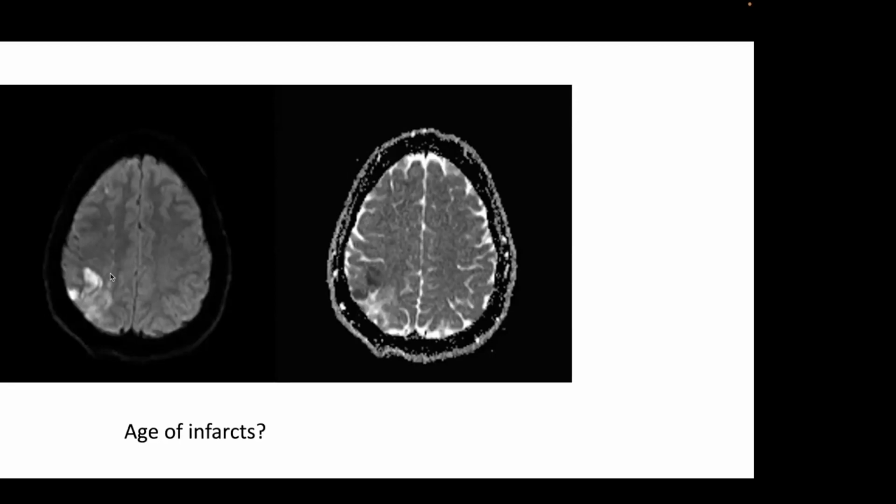of watershed ischemia here. You see this? All of these little areas of high signal. The problem with the diffusion weighted trace imaging is it's both T2 weighted and diffusion weighted. The ADC map is less T2 weighted. So this area actually has facilitated diffusion. This area has restricted diffusion. So there's an acute infarct superimposed on a chronic infarct.